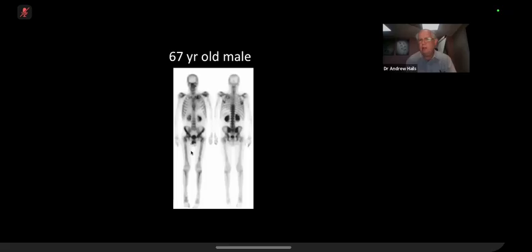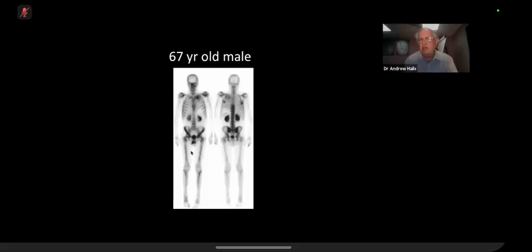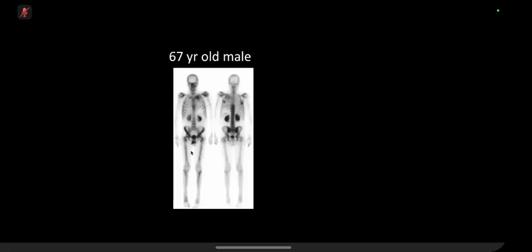Right. And this patient has malignancy, you're saying. Yeah, the patient's had a malignancy, yeah. So I wonder if the patient has got a left upper lobe mass.